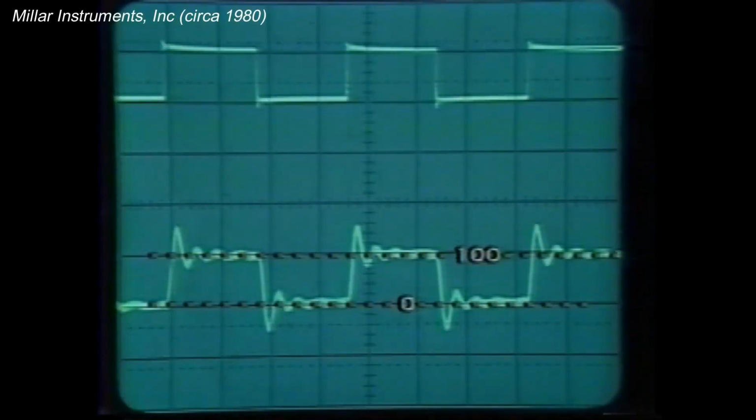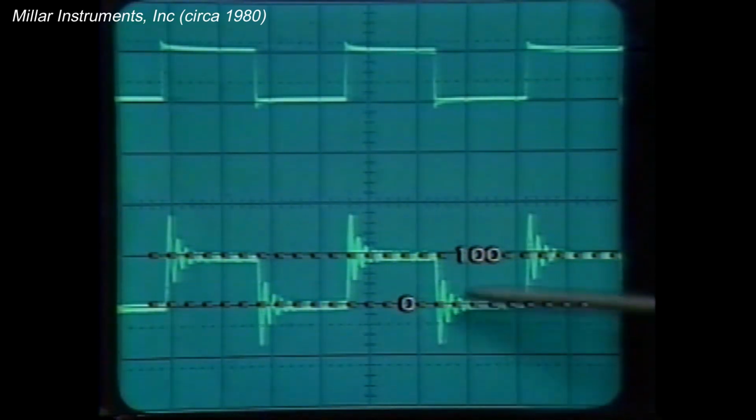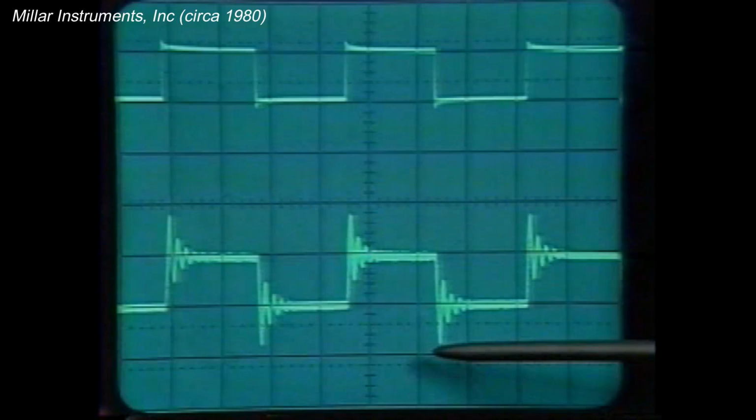Let's now flush the system and remove the air bubble. Notice that the resonant peaks have increased, as well as the resonant frequency and the value for dP/dt. However, with the increase in the size of the peaks, a patient monitor would indicate that systolic pressure had increased and diastolic pressure was even more negative than it was with the air bubble.